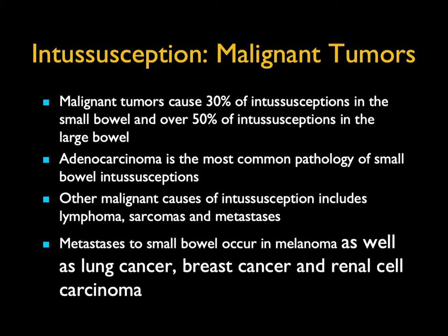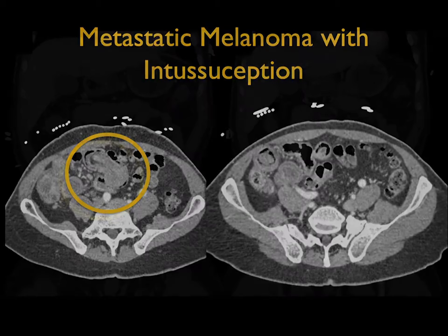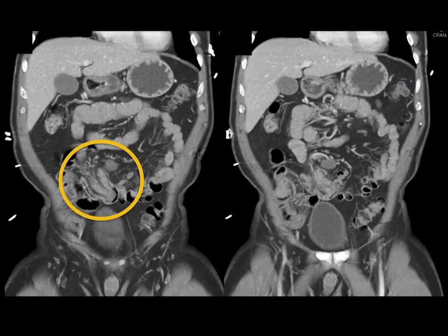Metastases to the small bowel occur also in melanoma, as well as lung cancer, breast, and renal cell carcinoma. So examples. Here's a patient with abdominal pain. To the right of midline, there's a large mass intussuscepting. That was melanoma. Often you don't even know the patient had melanoma, but melanoma is one of the most common causes of small bowel metastases, including intussusceptions, which is nicely shown in this example.